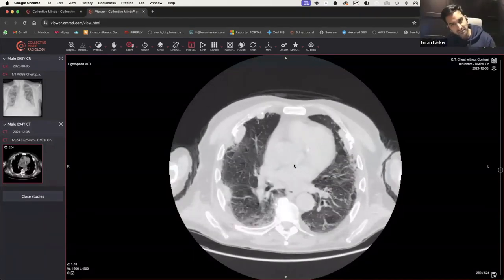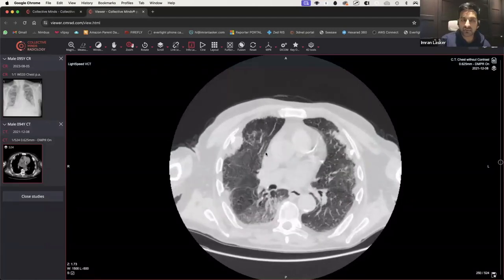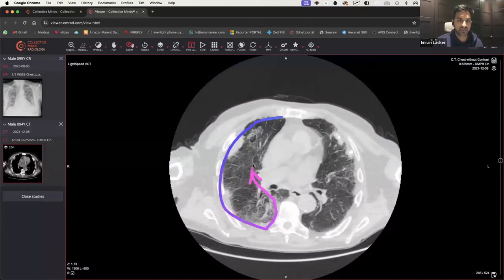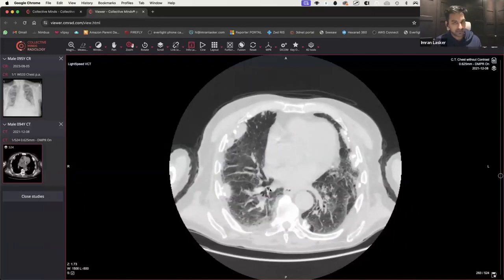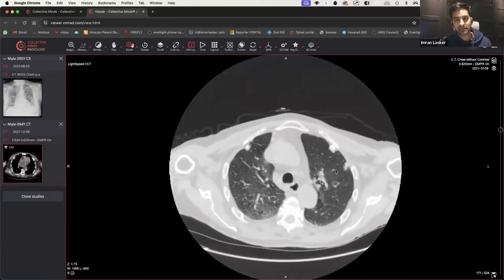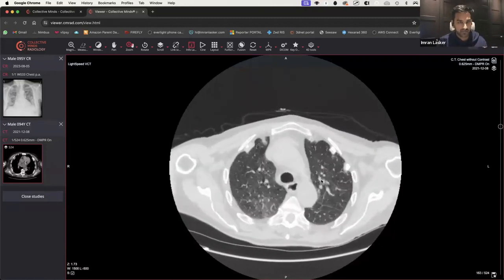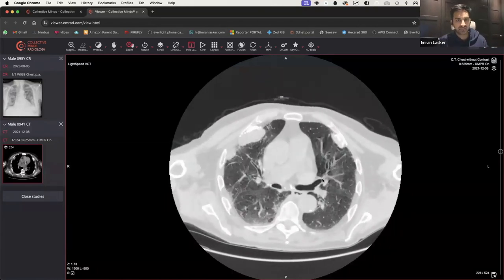You would worry about mesothelioma in a patient with asbestos exposure. The reason why it's not mesothelioma in this particular case is that it's not a circumferential pleural thickening. So this is the pleura here, and in a mesothelioma you'd be looking at circumferential pleural thickening, particularly of the mediastinum, along with the multiple pleural plaques. You do have multiple calcifications everywhere. They have breathed a lot, so it can be a bit difficult to really appreciate what's happened, but you can get a bit of fibrosis as a result of the previous asbestos exposure.